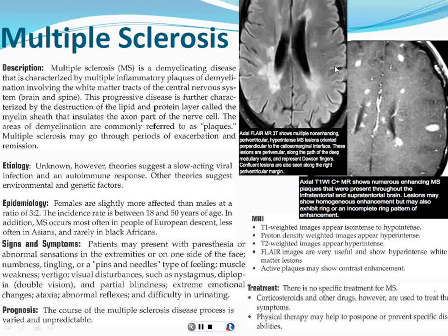you start to think about MS. And MRI is really helpful not just in detecting these lesions, but also telling us whether, this is a demyelinating disease, so you want to know if there's any active demyelination going on that you can try to intervene with, or at least control the symptoms of, and know how active the MS is being. So we do post-contrast imaging for this. So this is another one that you may want to suggest post-contrast imaging if it wasn't already ordered. And diffusion-weighted imaging, if you don't do it as a routine, can also show when there are active MS plaques.